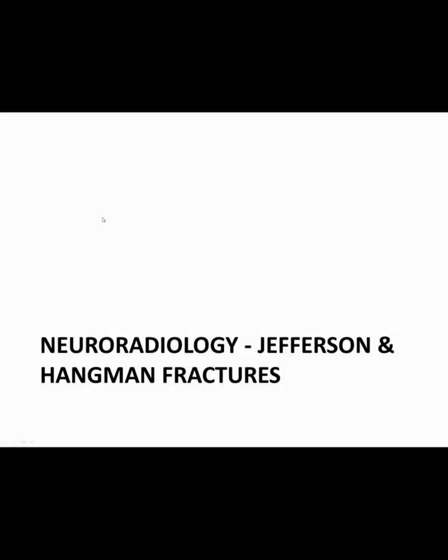This is a case of Jefferson and Hangman fractures. In this tutorial video, I will go through the case stem provided to you in the module. I will demonstrate an approach to the interpretation of C-spine radiographs, and we will go through the post-module quiz questions together.